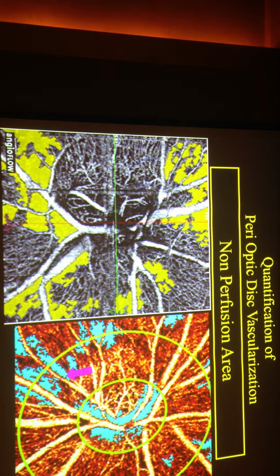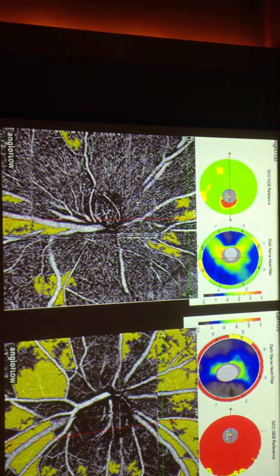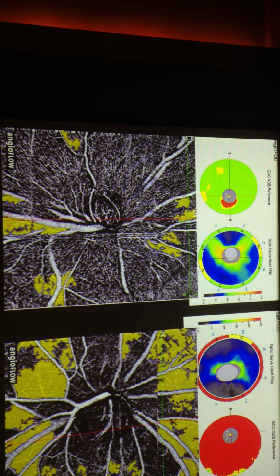And so as they are working all together, they try to improve the efficacy of this. But if you want this different kind of situation, you can see this. And now we have a very efficient tool with probably a quantitative approach to observe this kind of situation with moderate glaucoma and this kind of situation with very advanced glaucoma.